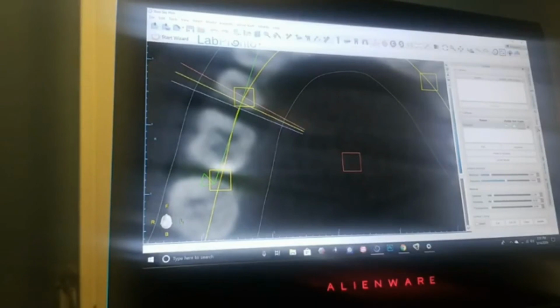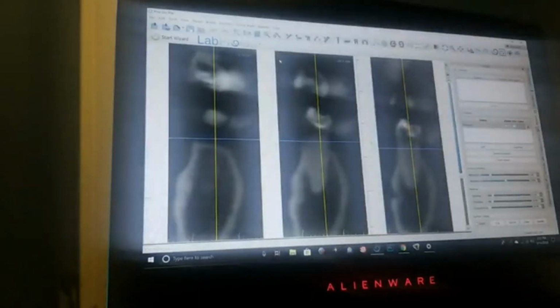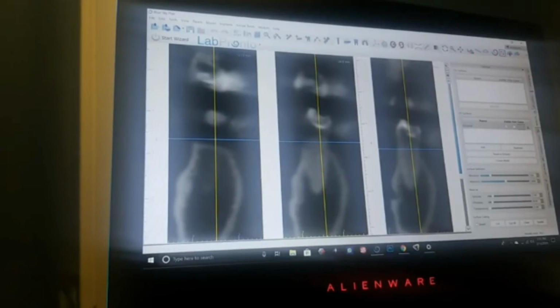Okay, so now let's close this for a second, and I'm going to maximize our cross-sectional. You may have a hard time and you have to trust me on this. There are three images here. You may be able to see it on the bottom. The middle one is very clear. You see how the middle one is yellow? You see these lines and the numbers?